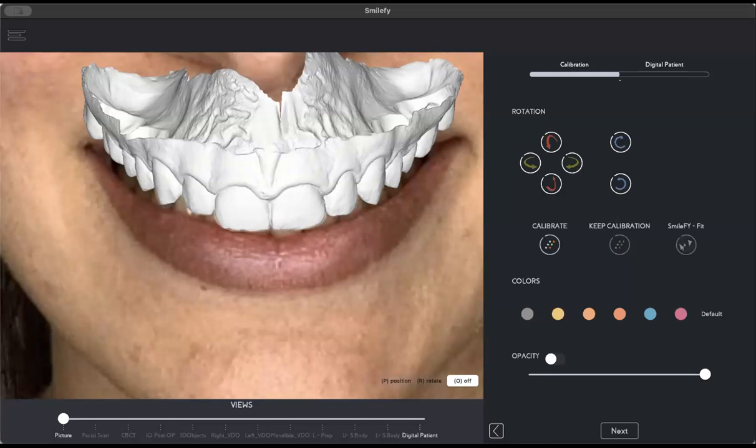So if you know SmileFy as a platform, we create smiles with SmileFy in a very unique way, but our vision is really to bring technology even more into the smile design procedure so that we can create the smiles almost automatically and adjust everything we need to adjust, and then be able to print the first appointment mock-up, export the project, send the project to the lab, finalizing the design with veneers, crowns, whatever it is, in a very, very unique way.